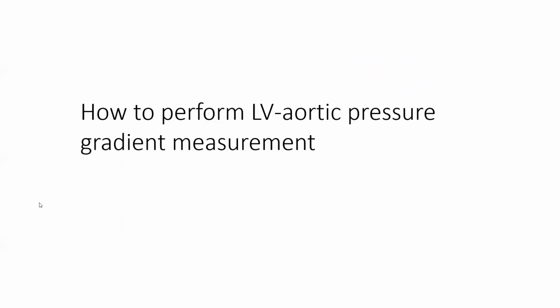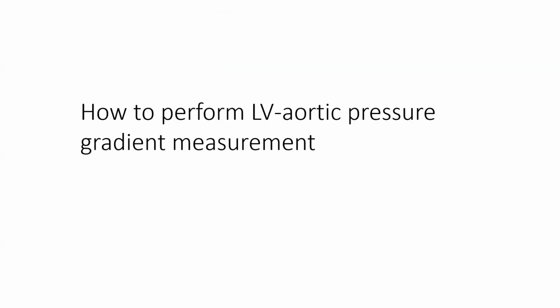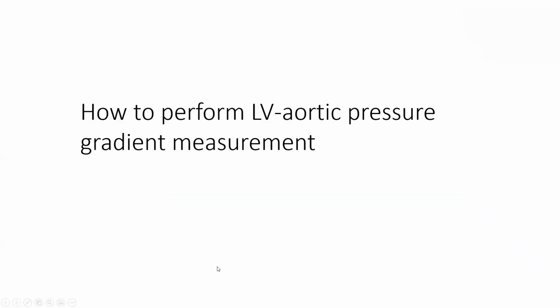Any questions so far before I move to more technical aspects? All right. So I'm going to describe how to obtain those simultaneous recordings between LV and aorta, or how to obtain gradients in general.